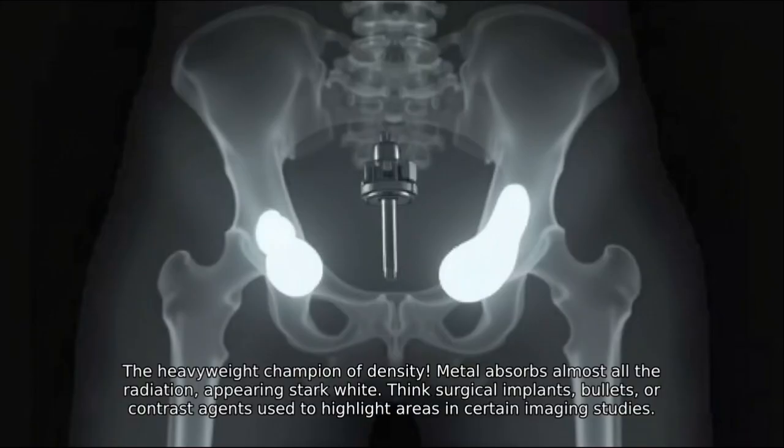The heavyweight champion of density. Metal absorbs almost all the radiation, appearing stark white. Think surgical implants, bullets, or contrast agents used to highlight areas in certain imaging studies.